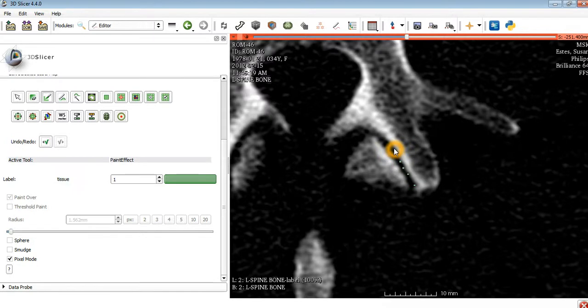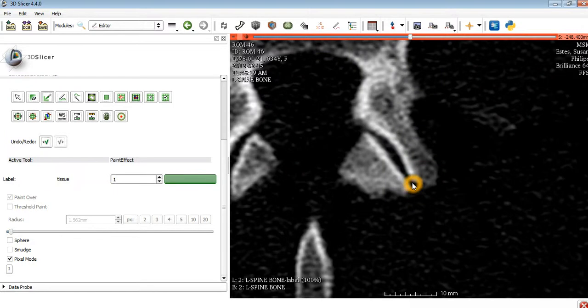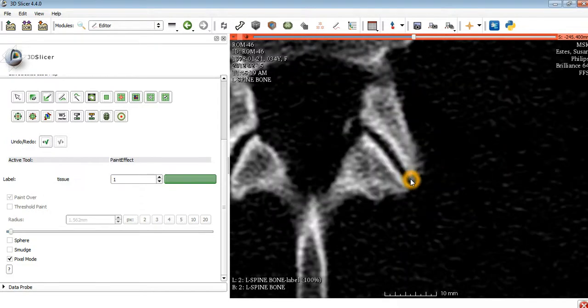And it doesn't necessarily matter how many points you do. It's more that you capture the surface, the curvature of the surface, more than anything. They don't have to be spaced at any particular equal spacing, but of course the closer the better as far as how this line is going to turn out, and we'll see that in the end.